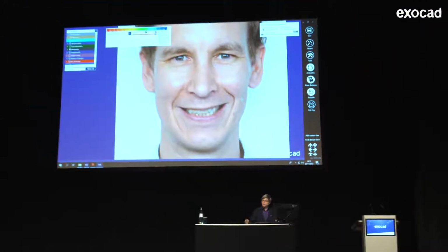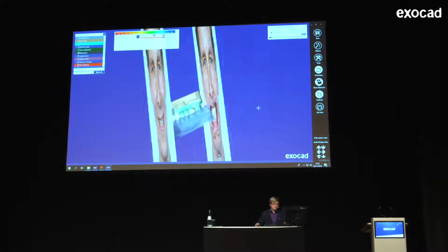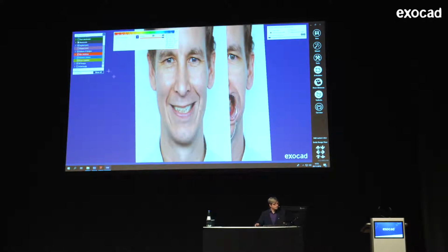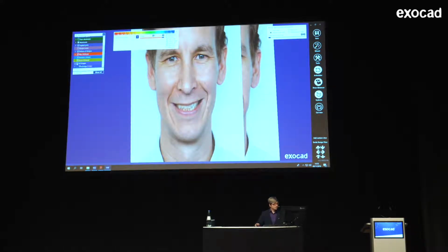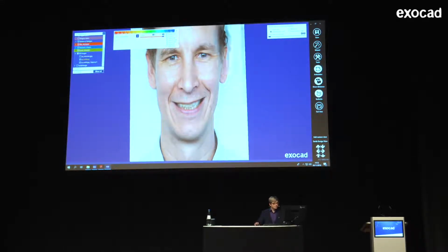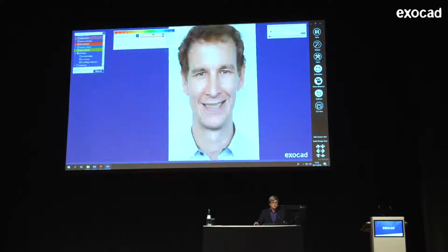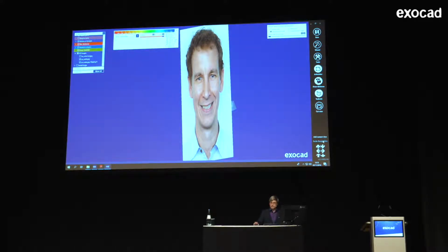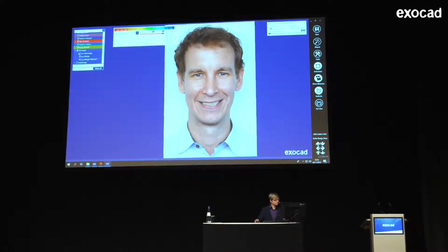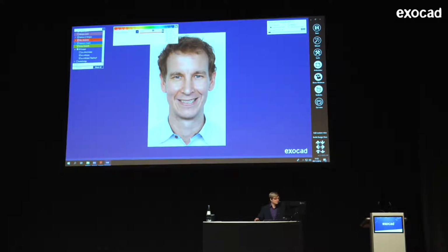And now you can actually see how the smile design works with the pictures, because if you tilt this, you see the model is just in between. And those pictures are now part of the project, and I can hide them, obviously, because here, those the 2D images point. And I can hide the retracted one. And maybe interesting, I can actually hide the clipping of the smile as well. But now I tilted the picture, and I get automatically here a smile design view, which sets the direction back to the view of the smile design. You can also get this view by just double-clicking on the picture itself.